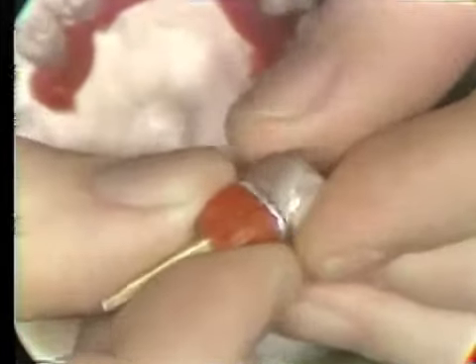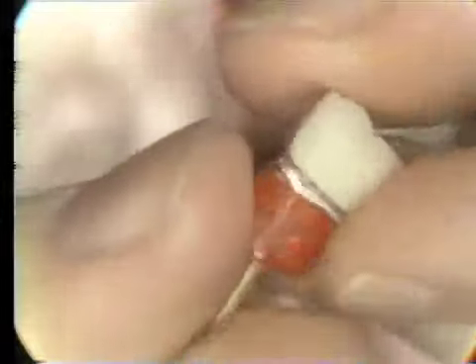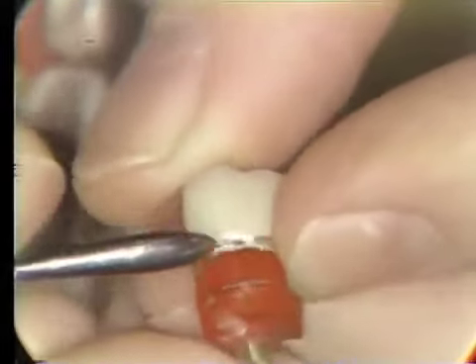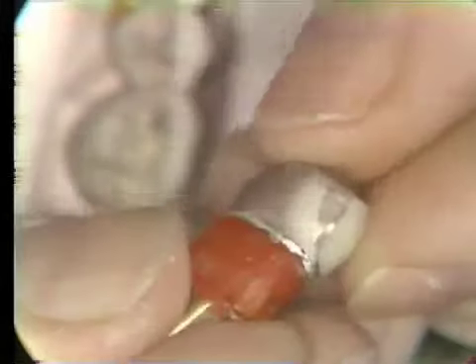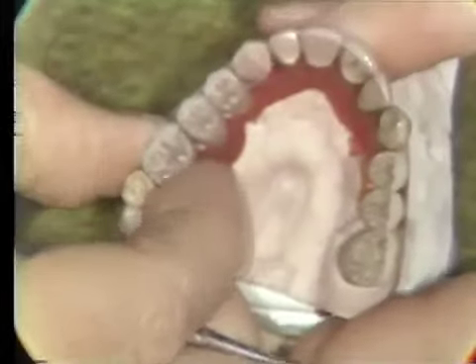Go around and make sure that the casting extends out to the margin that we have designated for the laboratory. Now on these posterior crowns we use a gold collar. This is more compatible with the tissue. In the anterior part of the mouth we wouldn't be able to use this because this would be obvious from the aesthetic standpoint. Now I wouldn't finish the margins down too closely at this stage of the laboratory procedure. If we were going to do a remount, you might damage the margins if you tried to thin them out too much. So we check the dies, the individual fit of the casting onto the die.